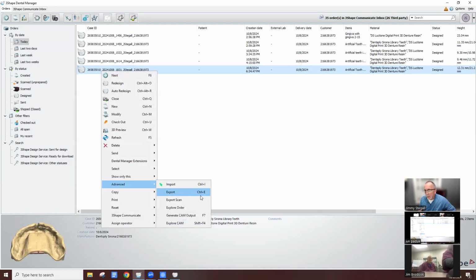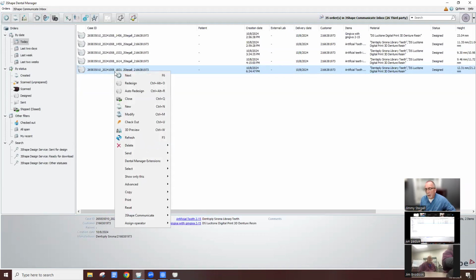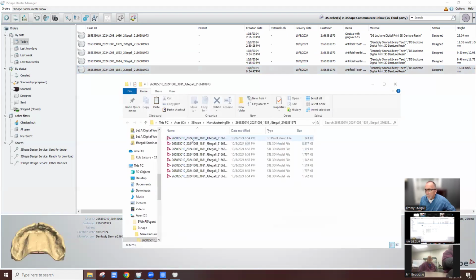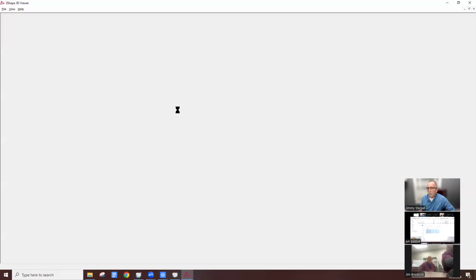And then it's like everything else, we'll generate our cam and take a look at this.